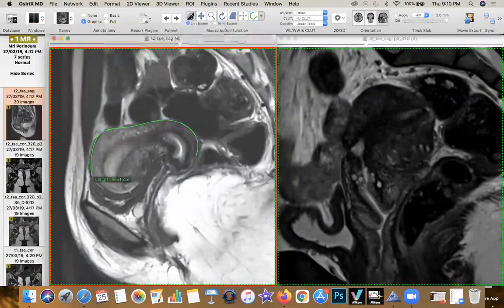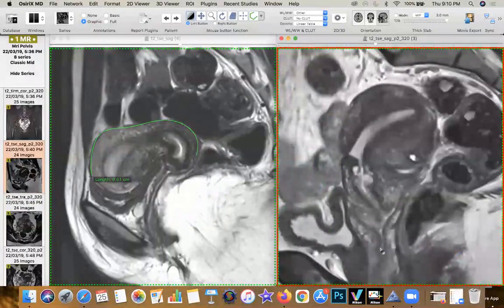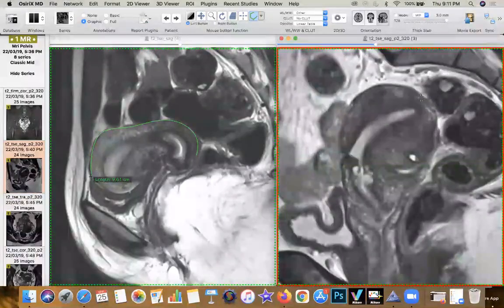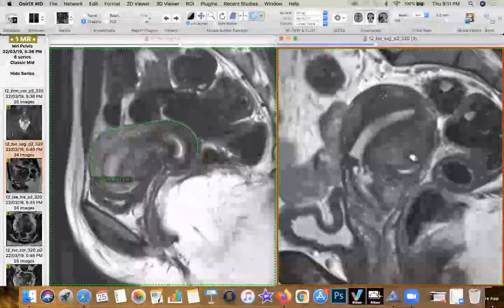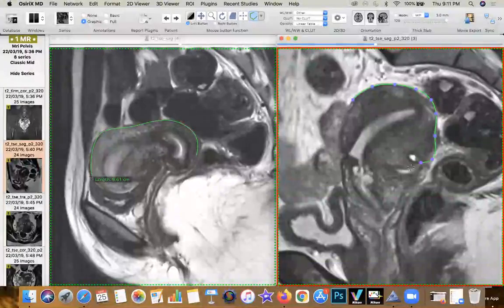At the same time, look at this case sitting up here. You can see the normal orientation of the cervix to the vagina. However, the corpus, instead of being classically antiflexed, is somewhere mid-position. It's neither tilted completely posteriorly, neither gone backwards, but there's this terminology called acute posterior tipping of the fundus. Now, ideally, this fundus would have been somewhere here, but there's something which is causing this change in the morphology of the fundus. So if I'm going to contour this structure, going up from the fundus to the posterior wall, you will find out what I'm trying to show you.